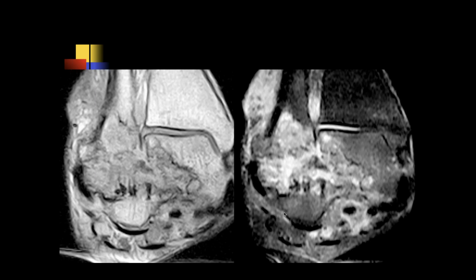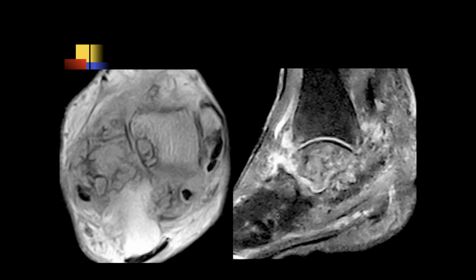Okay, Michael, a little subtle case here. Okay, yeah, so this looks similar to what I had seen on the prior one, except to a much more advanced and severe degree, if they've had inflammatory arthropathy leading to acquired flatfoot and then just severe progression of the hindfoot impingement. On this axial image, the talus and calcaneus aren't even aligned at all. They're completely subluxed to each other. Right. They're side by side rather than lateral.